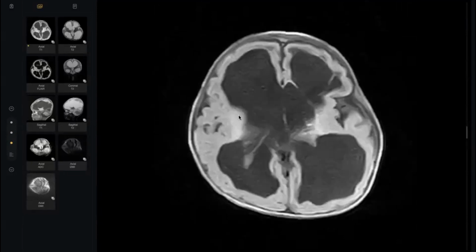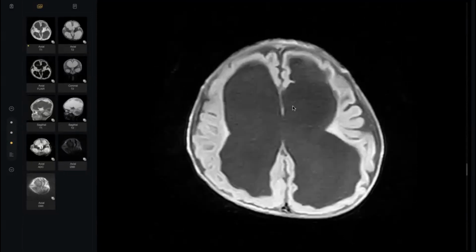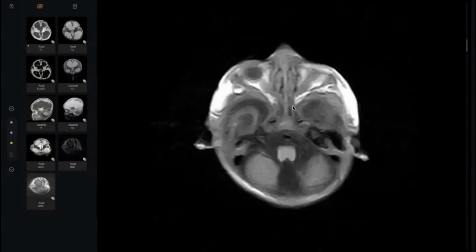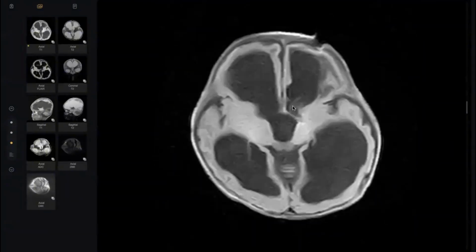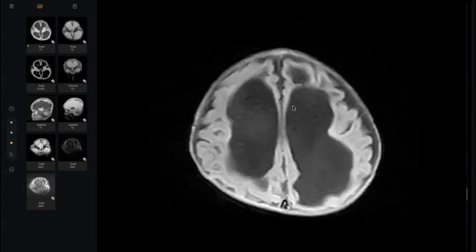So, what's your diagnosis? After follow-up, the blood decreased in size. What is the name of this diagnosis? This is a preterm neonate. Yes, this is type 4 germinal matrix hemorrhage. Excellent. Thank you, doctor, so much. Thank you, sir.